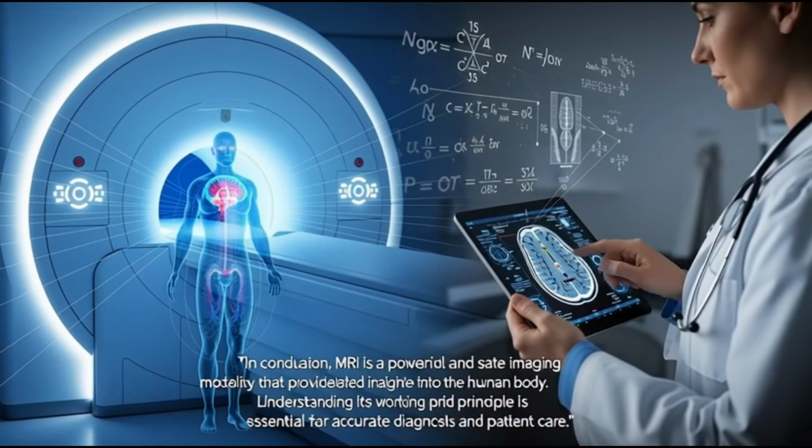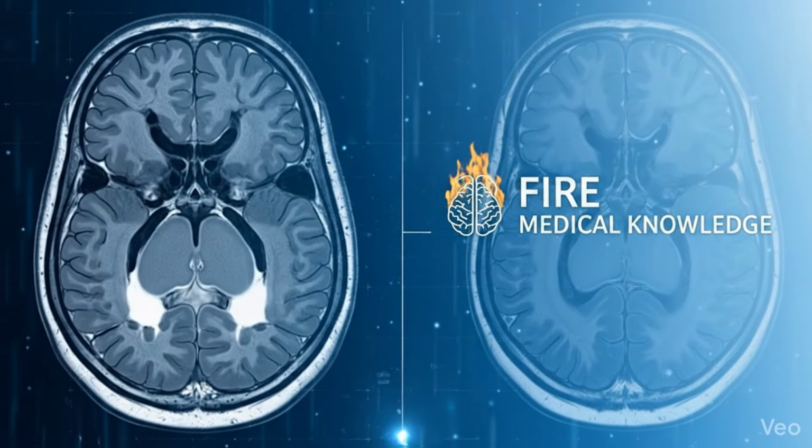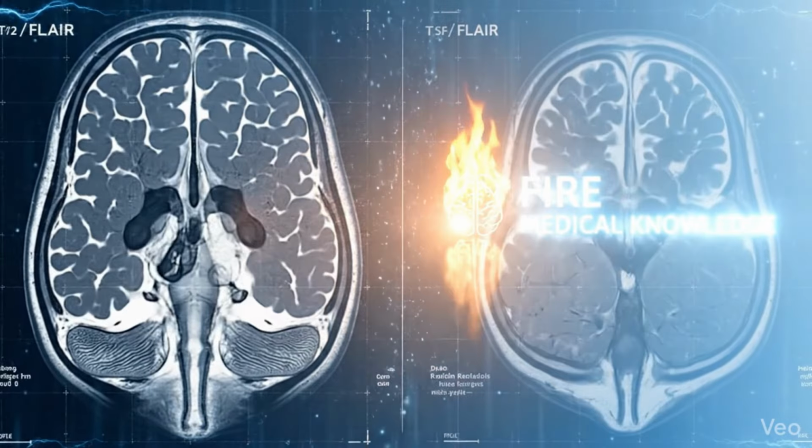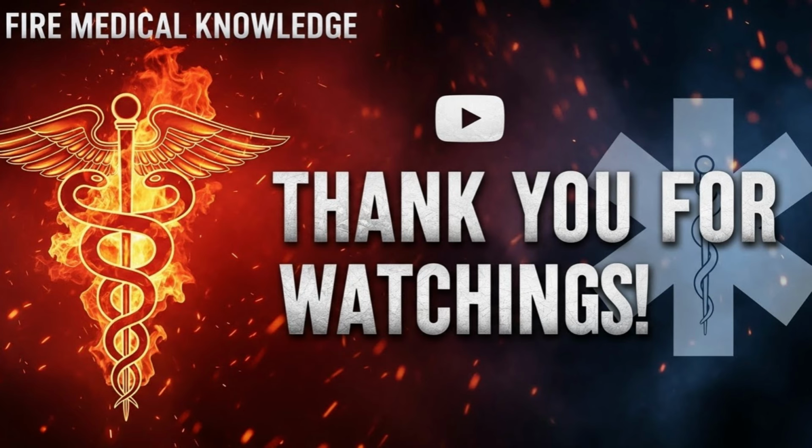In conclusion, MRI is a powerful and safe imaging modality that provides detailed insights into the human body. Understanding its working principle is essential for accurate diagnosis and patient care.